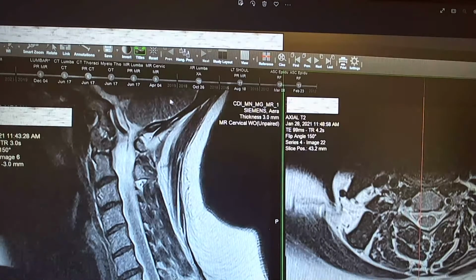You see now the cerebellum, and you see this division in the cerebellum. You know, cerebellum is very organized, and you see this section of the cerebellum. Now, you see here, actually, I think that is most likely the basilar artery here.